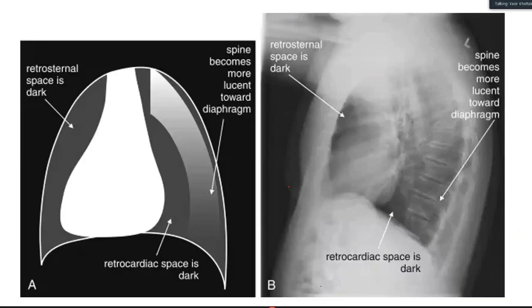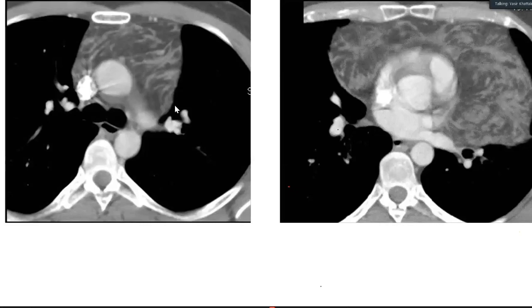So that's why we do a CT scan, because there is suspicion of a mass there. Sometimes patients who have a mass arising from the anterior or superior mediastinum can wrap around the heart, and then they can exactly look like a case of pericardial effusion, but it will not cause the retrocardiac lucency to be lost. And that's the reason for bringing up this case. This is a case of a thymolipoma, and a thymolipoma can cause an appearance like that.